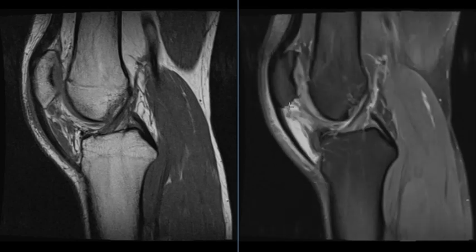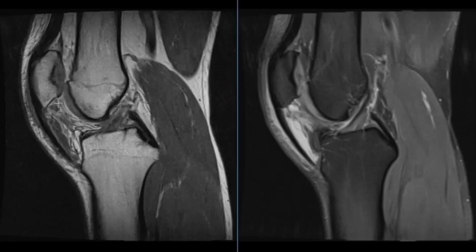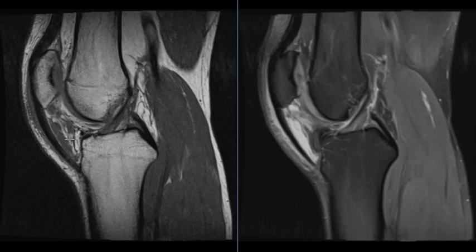The problem is below the kneecap in a little fat pad here called Hoffa's fat pad. This is Hoffa's fat pad here I'm outlining, so we have a regular fluid signal intensity structure in Hoffa's fat pad. And again, it's not prepatellar bursitis like is thought for the past 7 years.